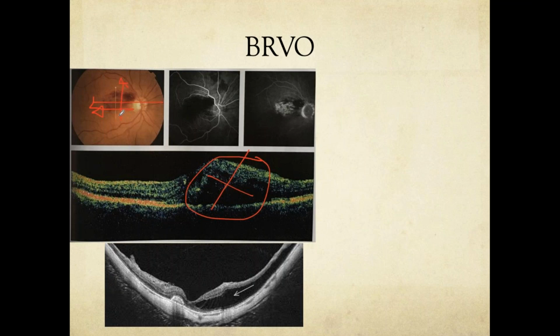So what has happened is, this retina is the normal retina here, and the abnormal retina is here. So I'm able to compare the normal retina with the abnormal retina. I can say, just by comparison, you see here the layers are good.